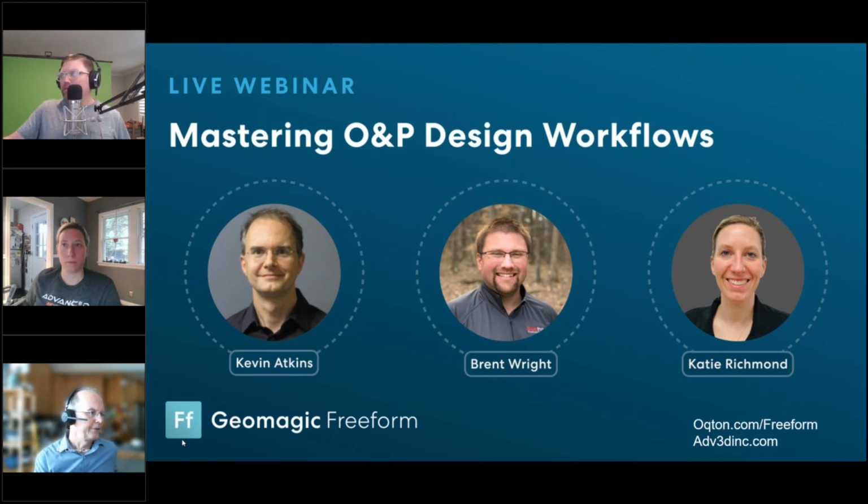Just letting you know, the haptics team have now put 2 buttons on the expensive haptic as well. Well, there you go. So now it's just going to be the expensive haptic. But I think that's a good point.